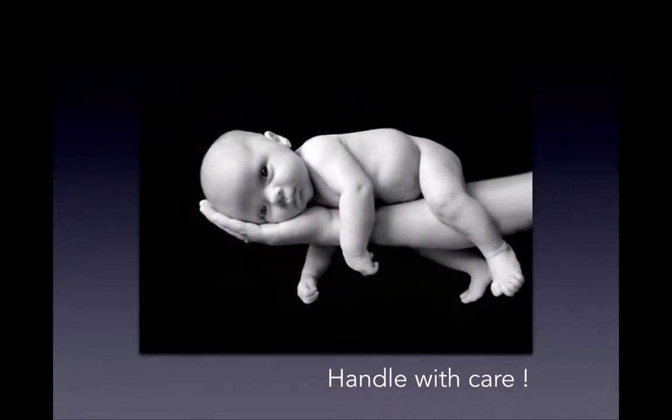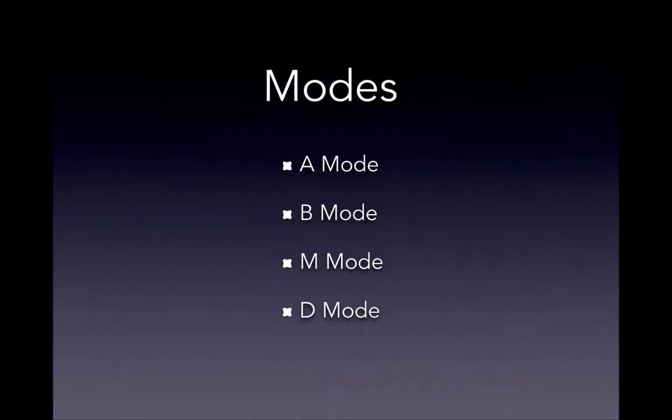Please be gentle, because they are worth more than my car. Each probe is about $15,000, and the machine is about 40 grand. So yeah, please handle with care.